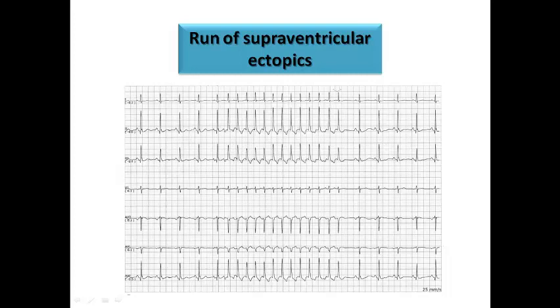We should not call this non-sustained SVT, because it is not an SVT and should not be considered an SVT, and should not be dealt with as, for example, a patient who is a candidate for ablation. No, it is just a run of supraventricular ectopics, which is sometimes a normal variant that can be seen in some patients, and when they are frequent, of course, they cause a lot of symptoms to the patient and may need rate controlling medications.